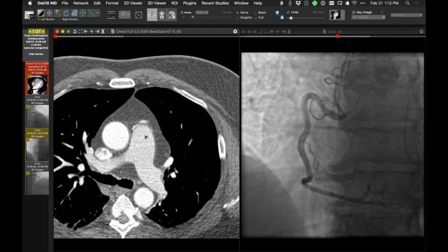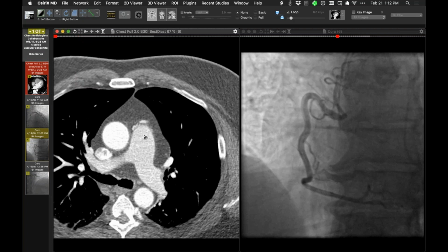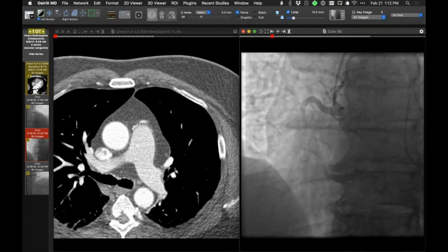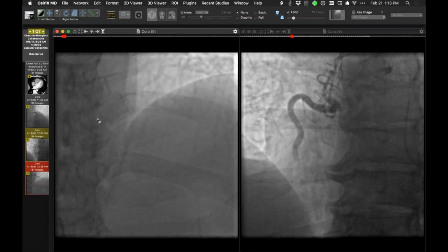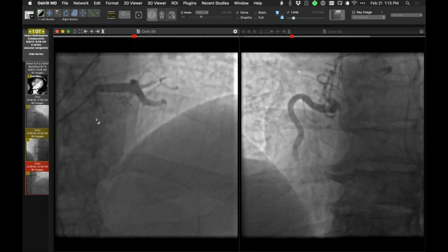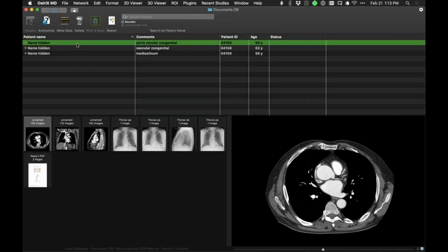Yeah, when they're that small, they're often incidental. And this is presumably congenital, is that correct, guys? Not acquired, congenital, right? Congenital, yeah. One can find lots of case reports of this kind of phenomenon. Like that. I did not see any coming off the left side towards the main pulmonary artery, just the right side up there. So curiosity. And then this one is just a nice kind of teaching case.